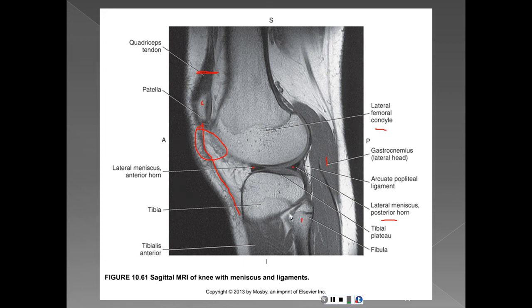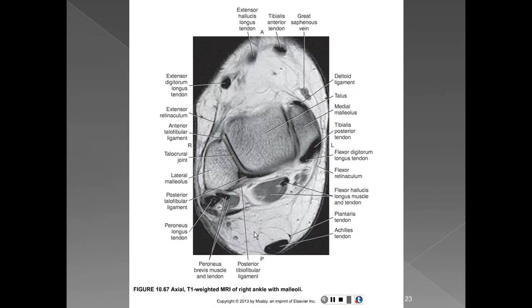This is the tibia. We know that. What am I saying? I'm so sorry. Fibula. We know that. The tibia. I was getting ahead of myself. We know that the tibialis anterior muscle is the little muscle that covers the anterior portion of the tibia, named properly. And now we have moved down to the ankle, and this image can be found on page 687.